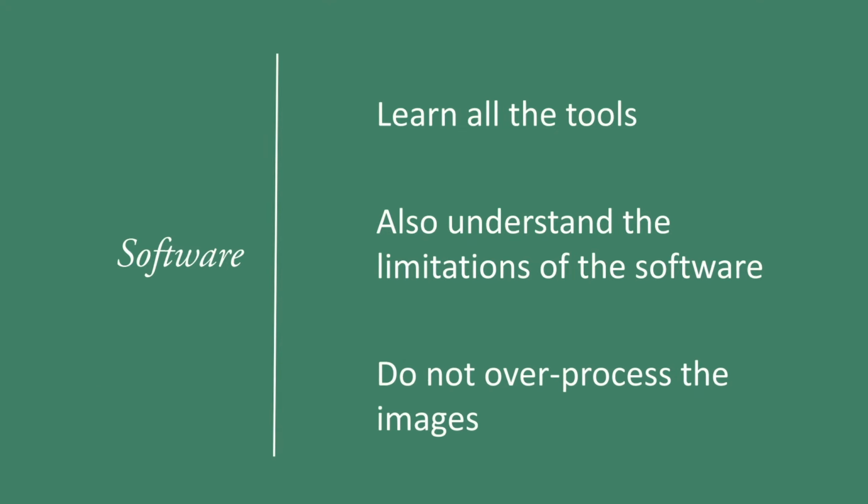Some processing of the images may be needed. I want to add a word of caution not to overprocess the image. While you may gain some diagnostic information by this extra processing, at the same time, you may also lose some other critical diagnostic information. With that foundation, let us learn how to systematically read a full mouth set of radiographs.